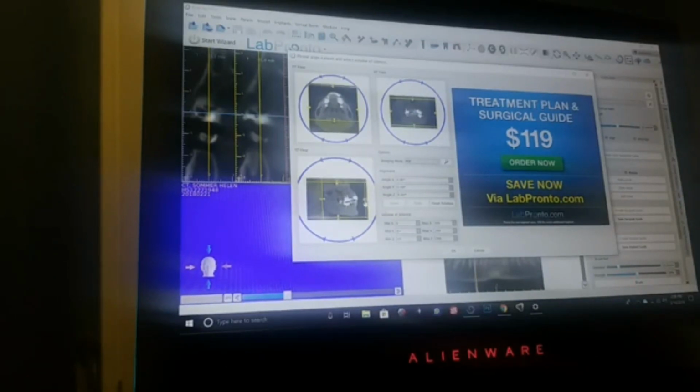Here as well, you want to close it up as much as you can to the anterior area. Make sure you don't cut off any area where teeth or bone are, because we want to look at all these areas. So now I've eliminated all these slices and images that are not useful.